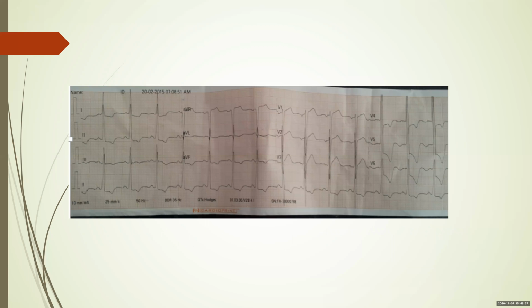Again, this is a typical case. This was actually a 35-year-old female who was on antipsychotic drugs and had long-standing hypertension for the past 10 years, and who refused to take antihypertensive medications. You can see marked ST depression with T inversions in V4 to V6 and in I and aVF, T inversions in II, III, and aVF with ST depression. These come with marked QRS voltages. Look at the QRS voltage. It's not contained within the ECG strip.